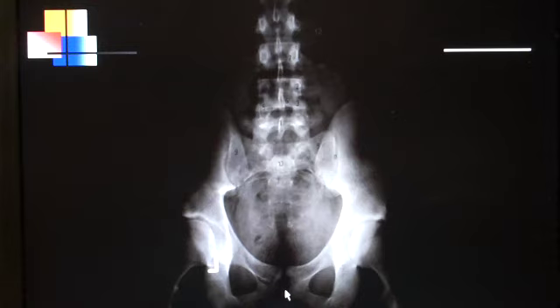You have the pubic symphysis here, and sometimes you can see the lesser trochanter, sometimes you can see the greater trochanter. They're right across from each other at an angle. See the femoral neck on this film sometimes. This film is rather dark. It is one that is out of the textbook, but it's rather dark as far as I'm concerned.